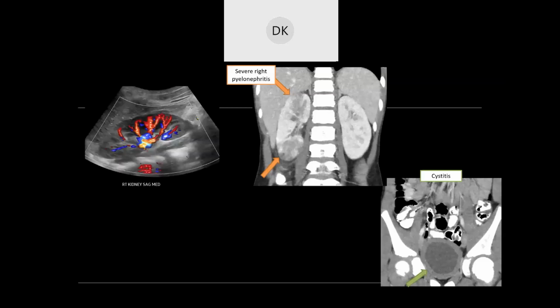And the patient ended up having a follow-up ultrasound 6 weeks later to see if the infection had resolved and if there were any other complications. And you might wonder, is there persistent pyelonephritis there in the upper pole? It seems like it's a little hypoperfused. And that's actually an area, too, where we often get a bit of echogenic artifact.